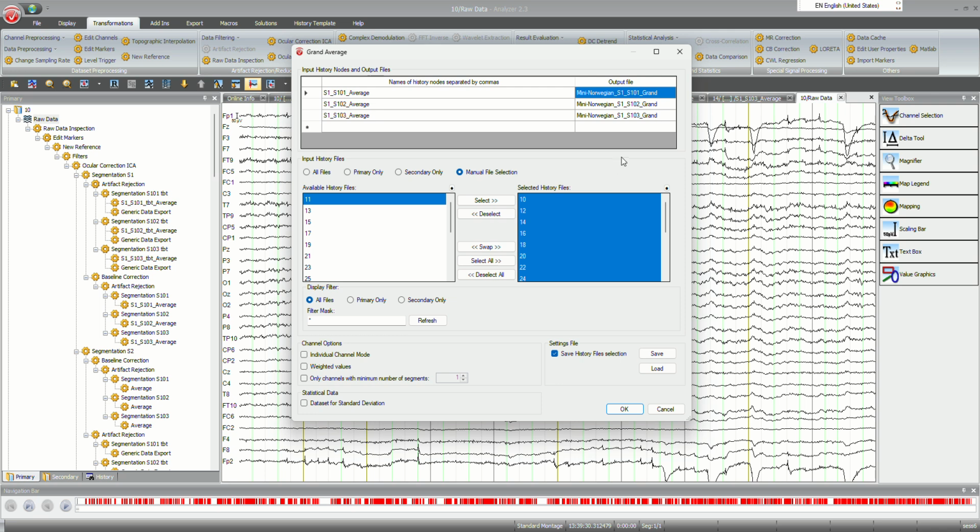So these parameters are to be retained, and then our next step is to add these kinds of assignments for the three other grammatical properties. Right, so I have added these, and we can see the assignment.